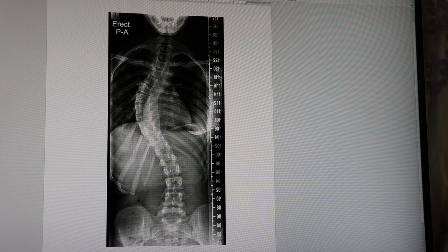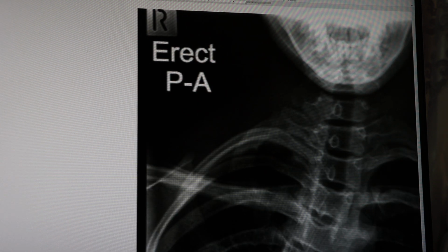Now let's go further and look at the thoracic region, and yeah, I do have the ribs. The ribs have clear edges, and even if you have a wedged vertebra at this region, if you have a closer look at this specific region, let's zoom it in.